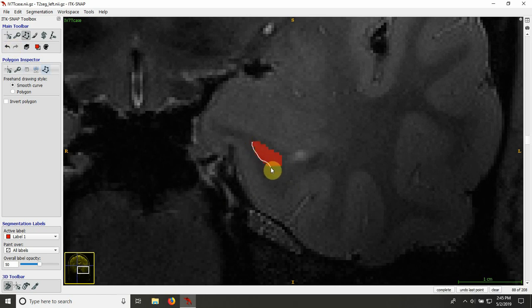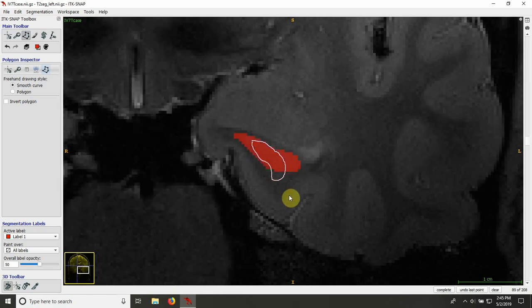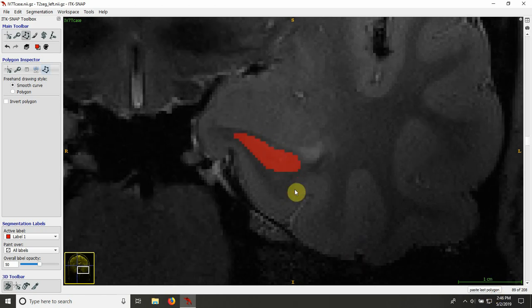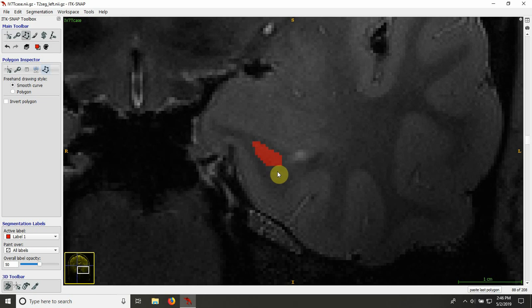So if something that you would see in this slice looks like this, I'm just making this up now, and then if you would go to the more posterior slice, it sticks out on this end, I think that would be very unlikely to happen from this outline to this outline in the next slice, so I think then this wouldn't be hippocampus. But given that this falls right in the middle here, I think this is probably going to be hippocampus, especially since we know this label is going to be smaller and smaller on each consecutive anterior slice.